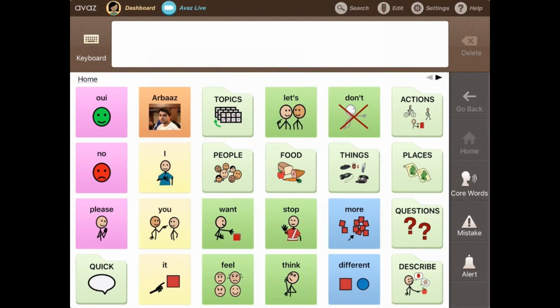So the questions can be entered on the panel that is on the right side of the screen. If you click on the questions tab, you're able to enter questions from where I'll be able to answer them.